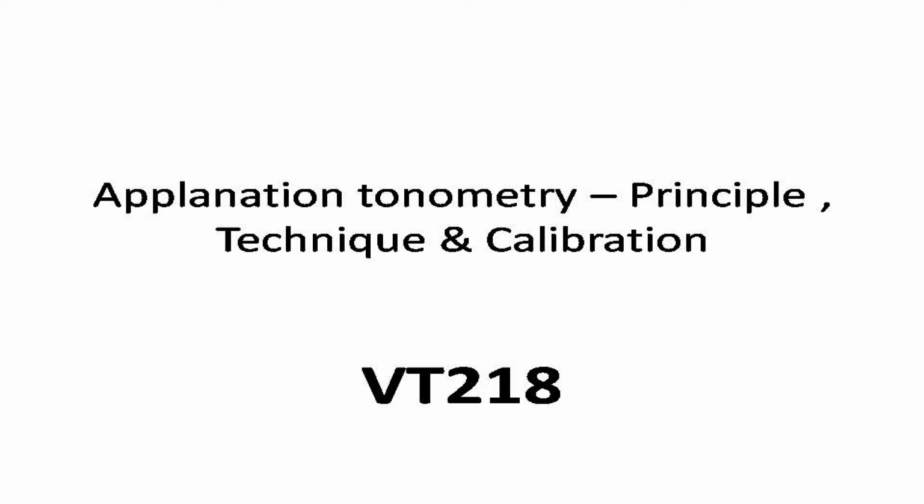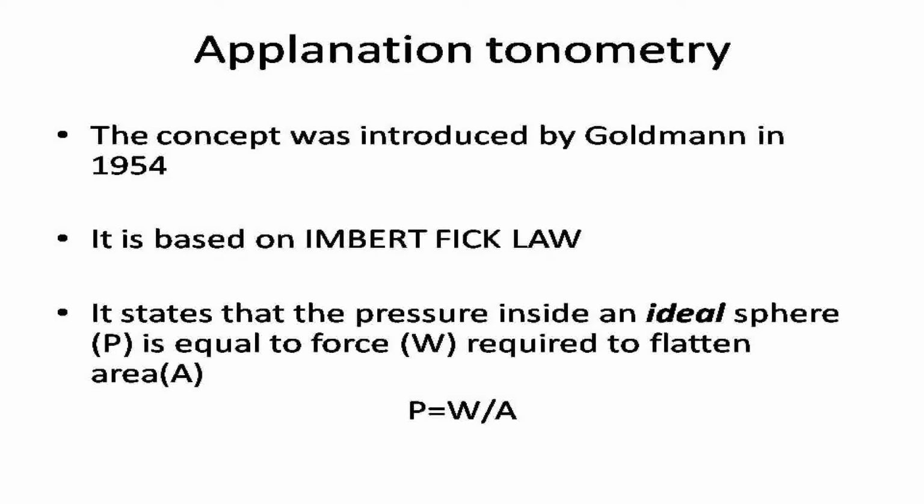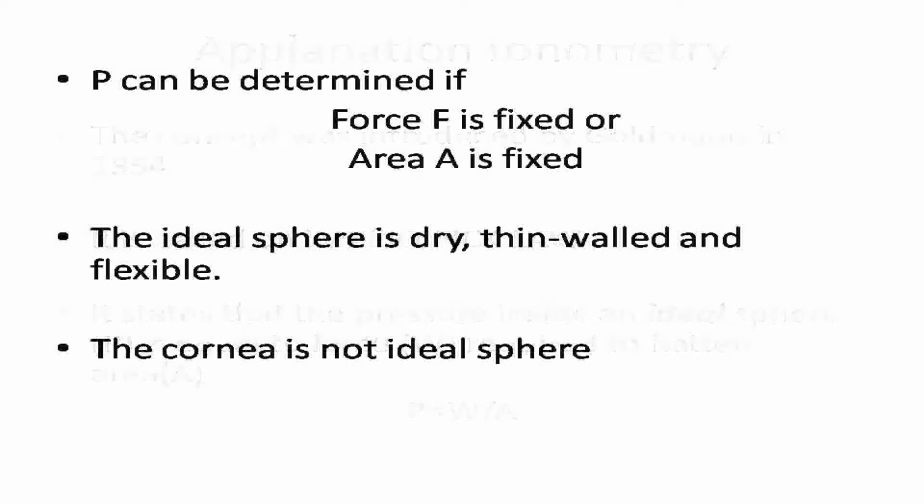Welcome everyone. In this video, we will be discussing applanation tonometry: principle, technique and calibration. Applanation tonometry was introduced by Goldmann, and is based on the Imbert-Fick law, which states that the pressure inside an ideal sphere, P, is equal to the force W required to flatten area A. P can be determined if force F is fixed or area A is fixed.